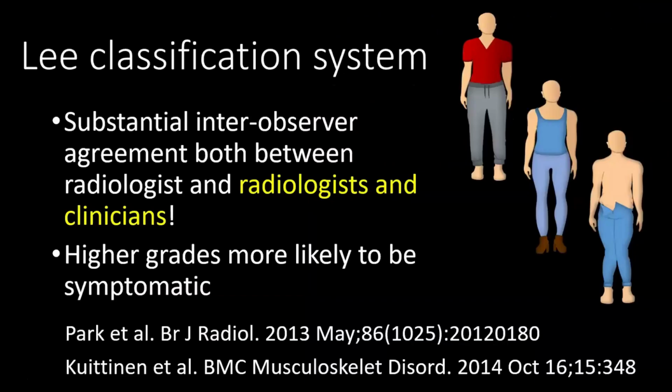So this classification isn't just easy to remember, it's actually evidence-based. This is the Lee classification that has excellent reproducibility, not just among radiologists, but also among even non-radiologists. And it does correlate with increasing symptoms.